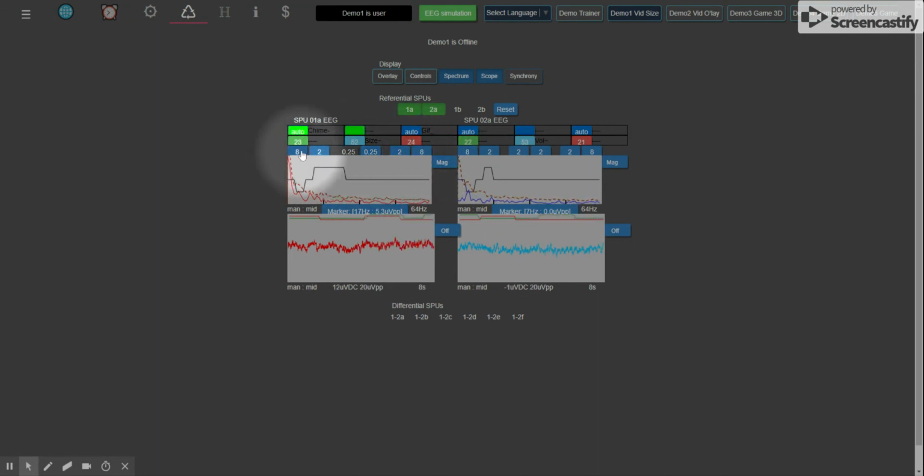These here control the logic rewards. The first one is how frequently do you want this logic reward to be generated? It's trying to adjust itself so that it gets generated every 8 seconds. And once it is generated, how long does it stay for? It stays for 2 seconds. That's the hangover. A logic reward generated every 8 seconds, which is sustained for 2 seconds. A logic inhibit generated every 8 seconds, and it's sustained for 2 seconds.